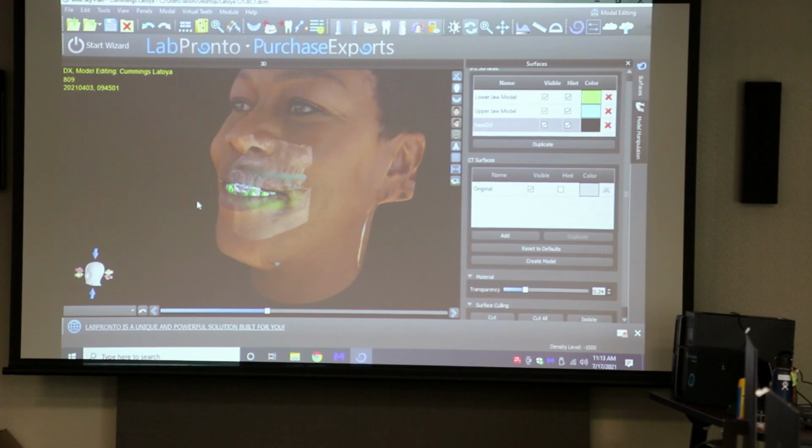Key thing is, honestly, for her, let's look at this case, she had a focused anterior part because we're going to be aligning this to the CBCT, and we ended up doing this right on here, so it's a little bit redundant. This is more so if you're using a wax-up supposed to be protruded and you don't have a CBCT.